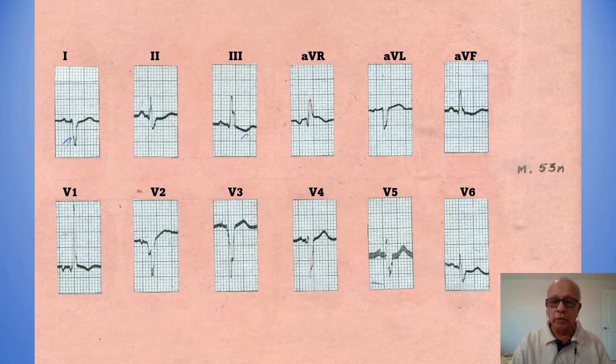So we'll go on to the answers to this. I gave you a little more time because I know this is a little difficult. There are 3-4 questions which I had asked you. That is, what are the findings in the ECG? Calculate the QRS axis of the patient, what is the clinical diagnosis based on the ECG, and what could be the cause for his dyspnea.